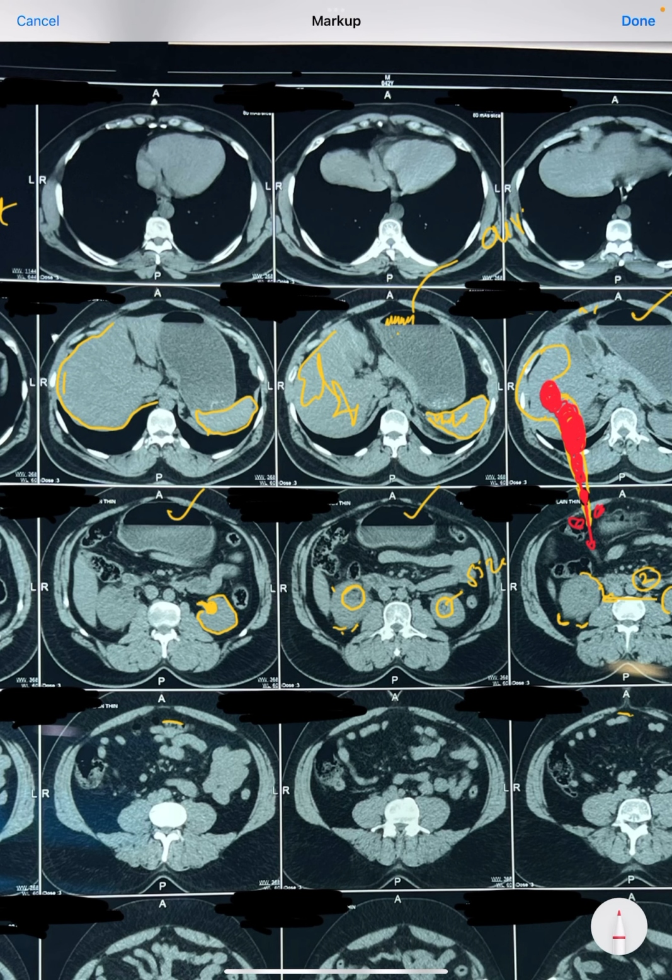What next? The kidney will dilate. There will be more and more pressure to the cortex. So the kidney will enlarge in size. There will be inflammation around, and there will be perinephric fat stranding. So there will be inflammation around the kidney, and this inflammation will simply put infiltration, white linings in the fat. Where is fat? This all is fat.